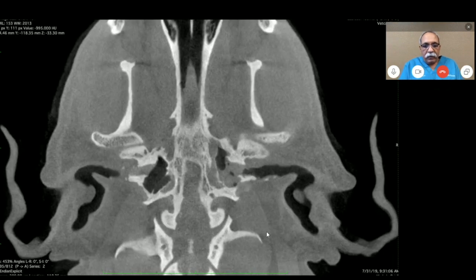The next one is another example of cholesteatoma. You can see it has invaded the middle ear a lot. This is uneven growth, so you can see some of the air-filled cavity in there. And cholesteatoma has a very strong odor. You can see the bone also, how much the bone has been destroyed from the osteolytic chemicals.